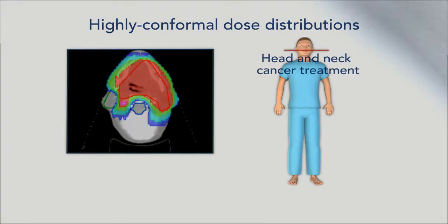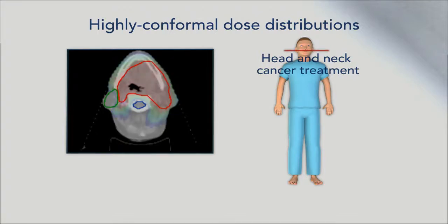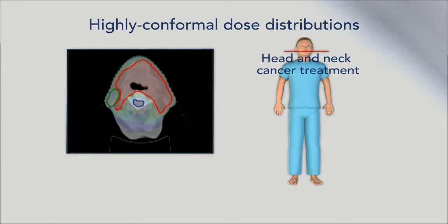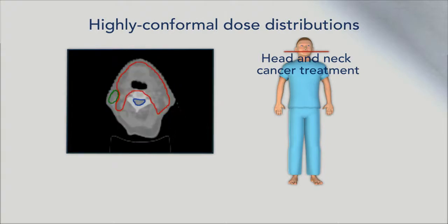Our unique technique enables a sharp distinction between tumor dose and dose to nearby critical tissues. The parotid glands produce saliva, and maintaining their function after radiotherapy treatment has always been a difficult challenge.